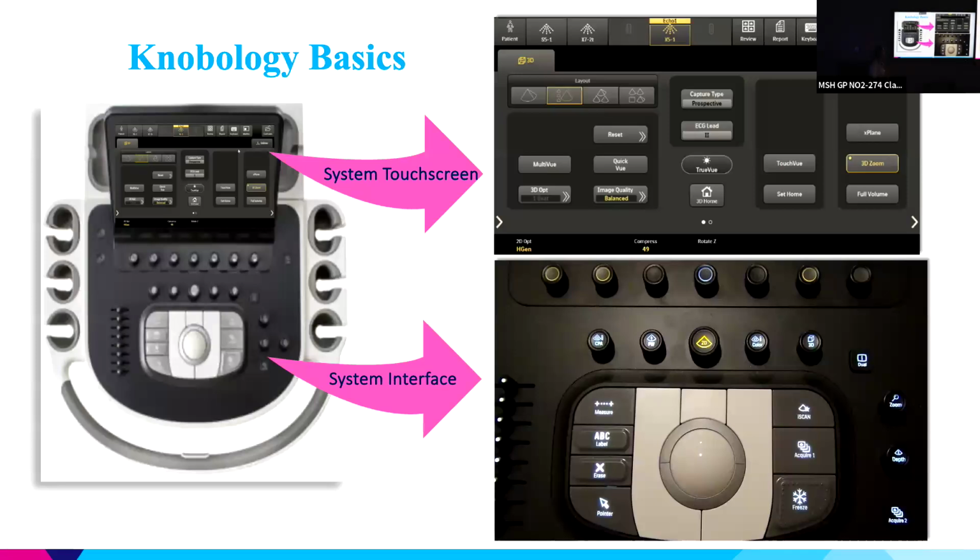So, knobology basics. Again, this is more of a hands-on kind of talk, so hopefully next time I give this, I will bring a machine. I thought about it today, but next time. Regardless, I will have screenshots like this for the whole talk to help you figure out what to do. The system interface is a touch screen when it works, and then the bottom part is the system buttons, which you all know.